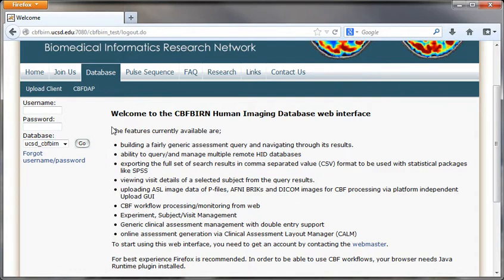Second, associating clinical assessments at the time of data upload allows for repeated measures study design, namely the same subject scanned twice under two different study conditions. In order to do this, simply upload two sets of data using the same subject ID, but assign two different assessment scores. We will show you how this is done in this tutorial. So let's get started. Let's log into a demo account.